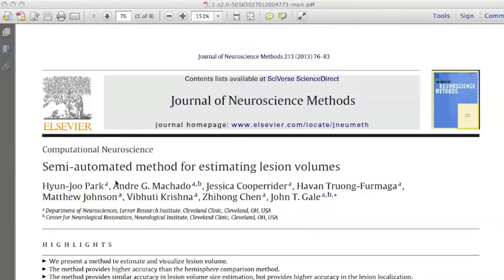To use SLICE, your brain sections should be coronally sliced, with the sections being equidistant from each other. Our sections are Nissl stained, and that works well with SLICE, but really any stain that provides a distinct border between the lesion and the rest of the tissue will also work. Another thing to keep in mind is that the inner slice distance should be the same for each brain. So begin by collecting and organizing your images to analyze.